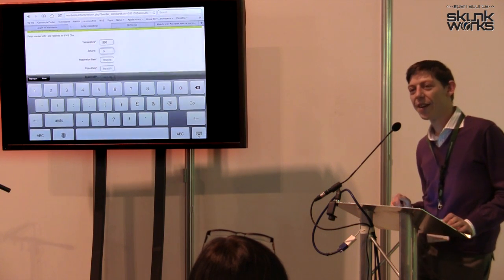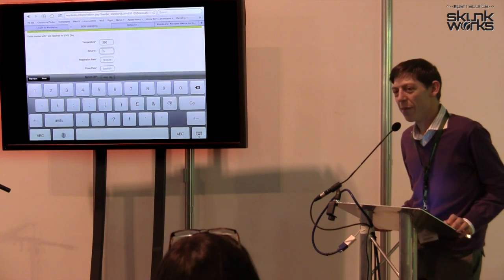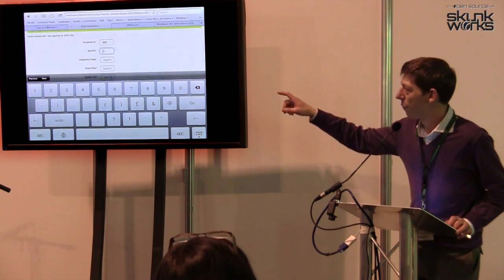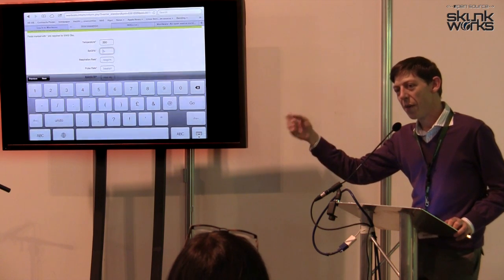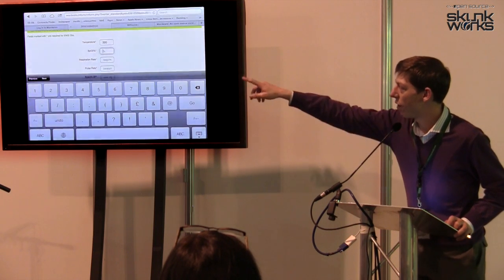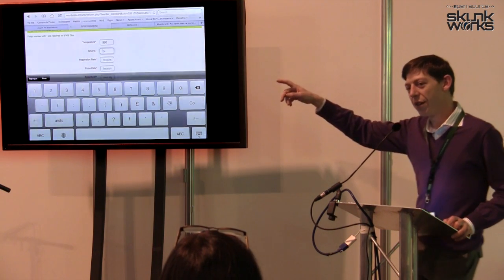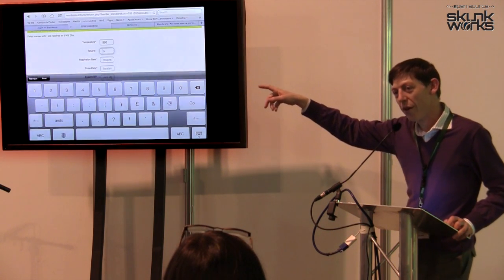Blood oxygenation. One of the things that we discovered when we were developing this is that when you have a numeric input like this, the keypad doesn't display a decimal point. So in order to speed up the data entry for the nurse, we just put in the 3 figures like that, because you're never going to have a temperature of 390, and the computer can insert the decimal point for us.